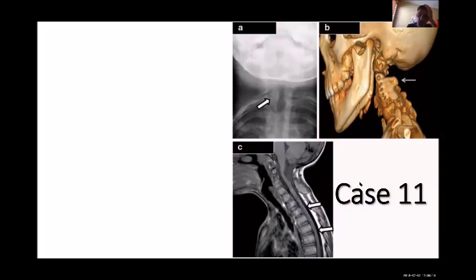Sorry for the interruption, who was describing? Me, Dr. Yahya. Go ahead. There is a compression of the spinal cord into two regions with maybe some extra bone there, something like that, if I'm right. Oh, okay.